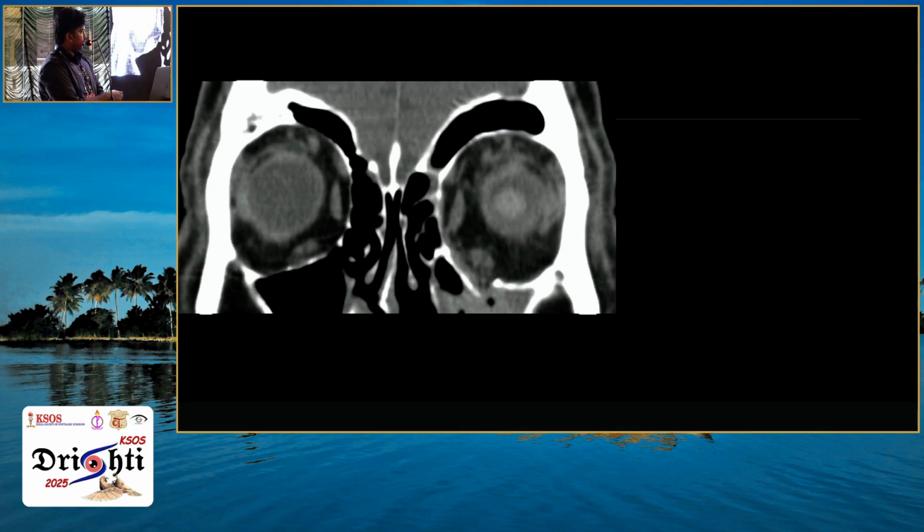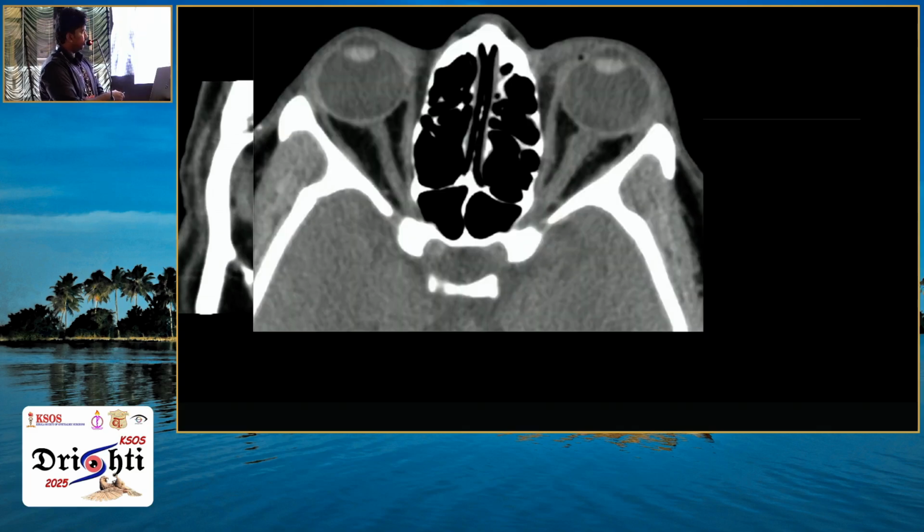And compare. This is another trauma image. Compare on both sides. Four walls of the orbits here. Orbit is looking nice here, and there is the optic nerve here. And floor, coming to the floor of the orbit. Floor of the orbit is looking asymmetric on the left side. Break on the left side. Little bit of fat herniation inferiorly. This is a blowout fracture of the orbital wall.